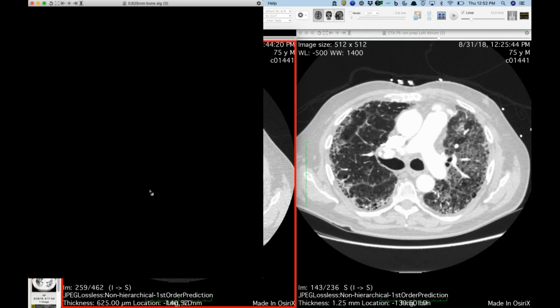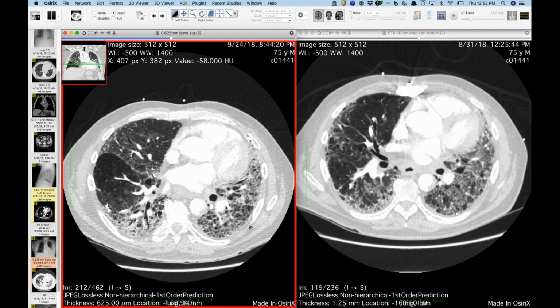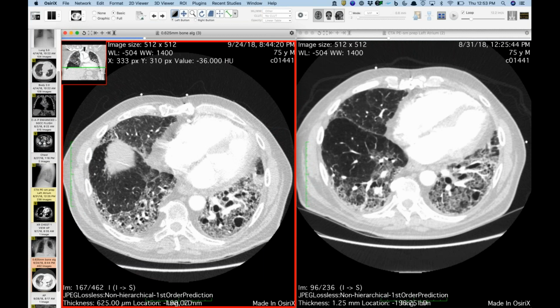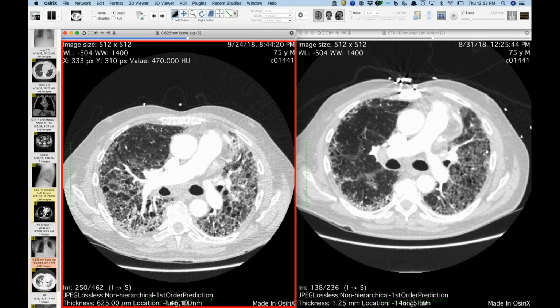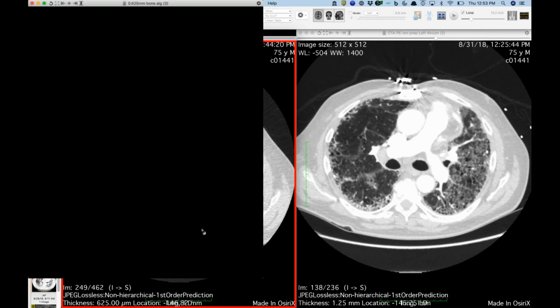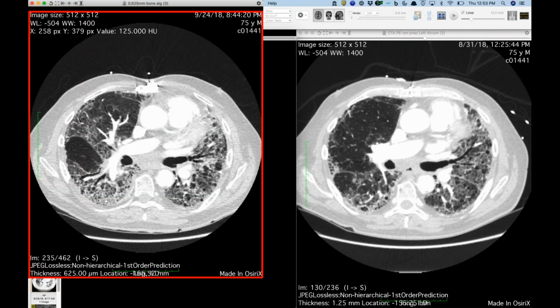But this is so widespread, it's not the typical radiation pneumonitis in the field of radiation. So this is some systemic. Sure. Yeah, I think it's right. It's the radiation that's the trigger of the acute exacerbation. Right. Amazing. And so there was no diagnosis of alveolar damage or organizing pneumonia or something like that. There was no histology. I mean, we've had a few that go to transplant, and that's what you get with this when you explant the lungs. But he wasn't a transplant candidate. It would be the acute lung injury or organizing diffuse alveolar damage, depending on the time frame.